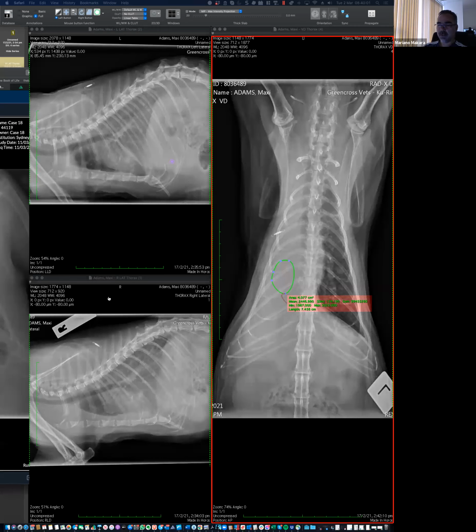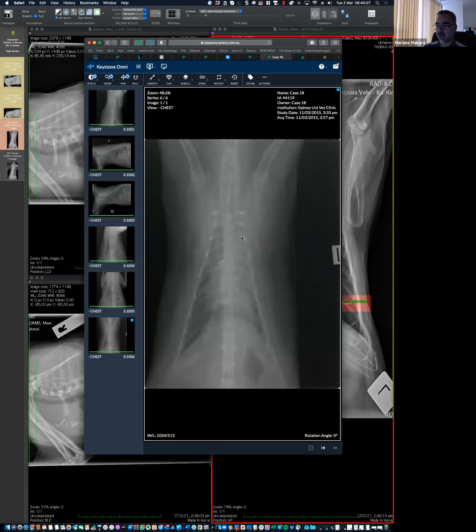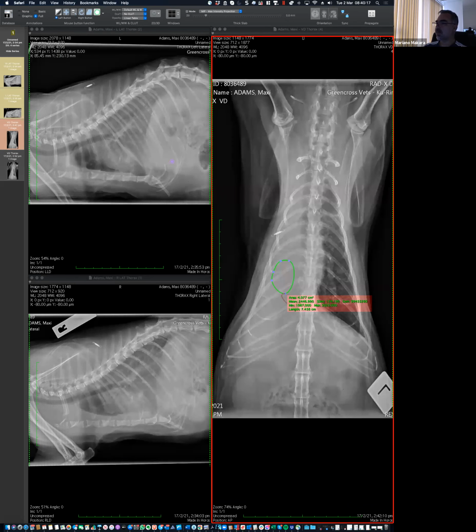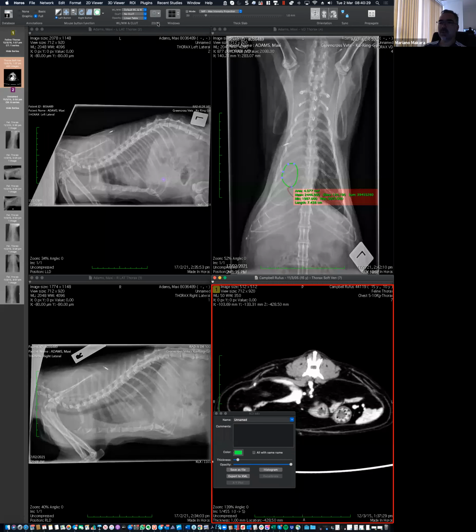This is the radiograph. In that case, this lung lobe affected all this side, not as much. So there is some degree of air in there, but this is the appearance that we got. And then I'll show you the CT, because I think it's worth seeing how it extends through the airway. I think it's going to help you understand what's going on. And again, this is not the same animal, but I'm pretty sure we are dealing with the same disease process.